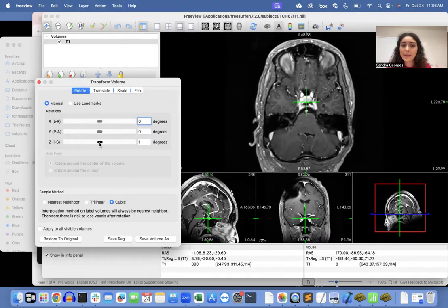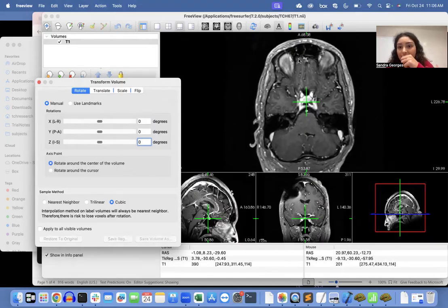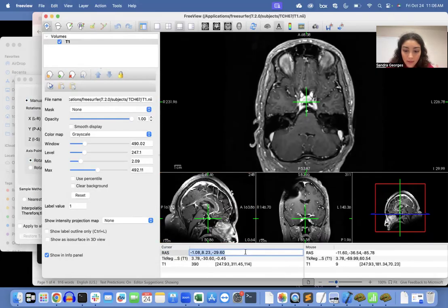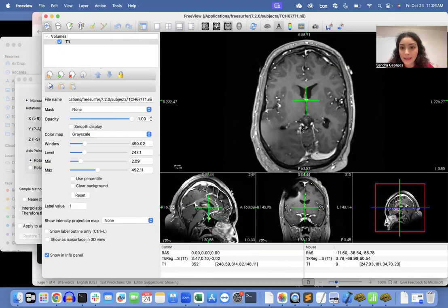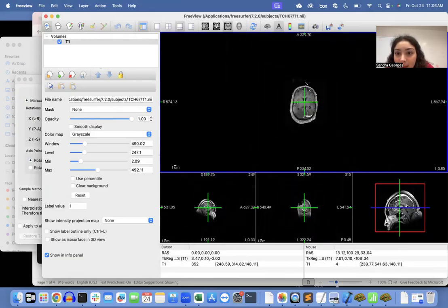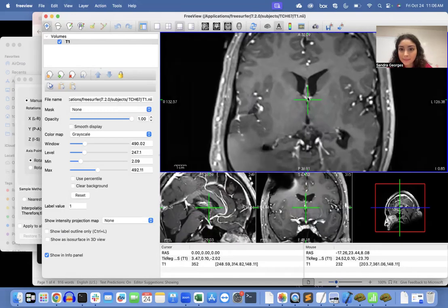So not an excellent example of a super difficult case, but because this brain is a little bit abnormal, it is good for showing how it is anatomically, I would say. So, I mean, this looks pretty in line. I'm going to zoom out just a bit to see how it looks. But it looks like it's quite well placed down the middle.